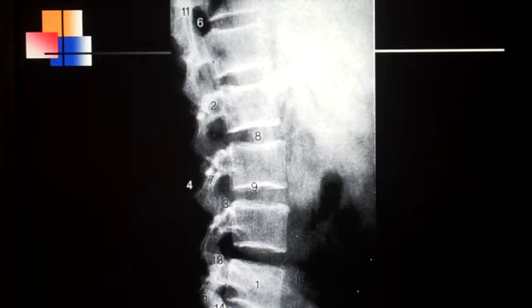The superior anterior aspect of S1 is called the sacral promontory. Number 9 would be the inferior vertebral end plate, and number 8 would be the intervertebral disc space. 6 is labeling the IVF, and 11 is labeling this rib that's coming down right here. Number 7, again, superior process here, inferior process here. What connects the two is the pars interarticularis. If you see this really white image right here at the tip of that number 7, that is the transverse process coming straight at you.